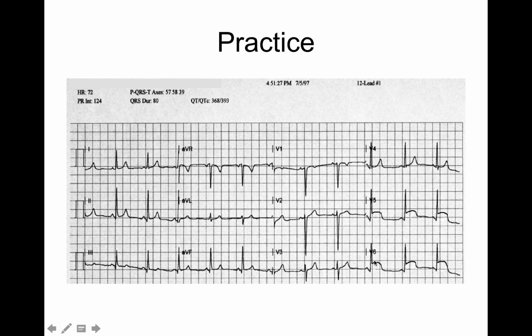So we have ischemia, injury going on in the lateral portion of the heart. Two contiguous leads, V5 and V6. So this heart attack is very subtle, but it's kind of big. It's the lateral portion of the heart. You can double check and see if there's other portions of the lateral portions of the heart. And no, so this is a good heart attack to reverse right here.